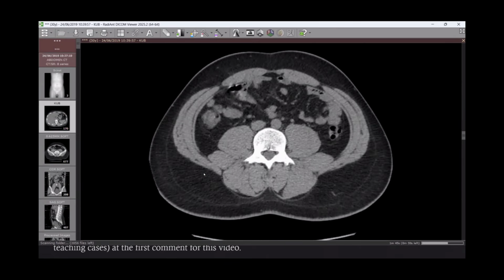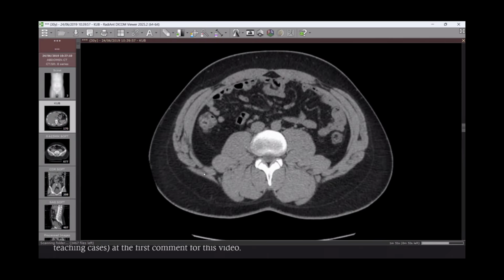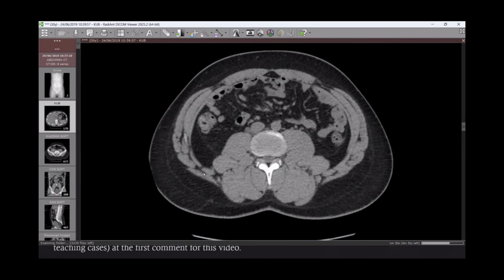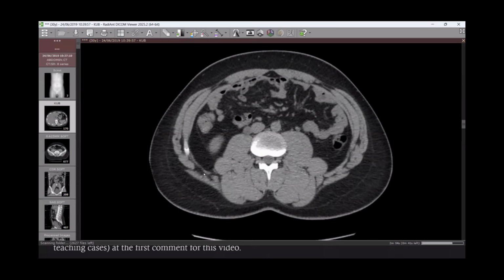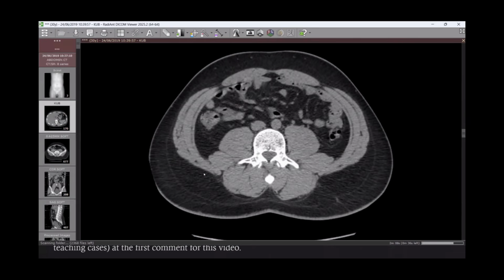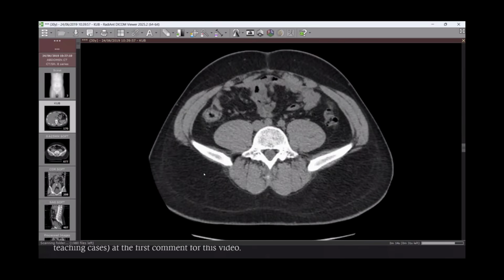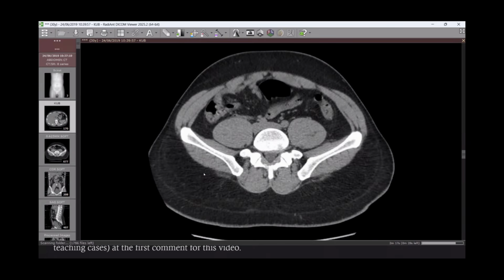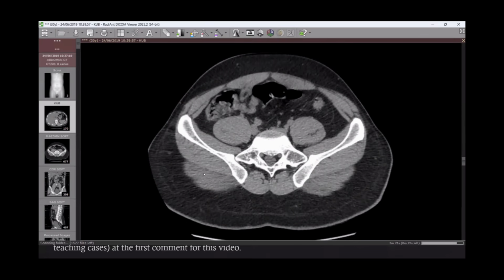I couldn't identify the right ureter at this level. However, I couldn't see any soft tissue mass lesion or dense stone in this area. While tracing, I can see curving of the right ureter posterior to the IVC. I'm thinking now of other possibilities like retrocaval ureter, while I'm still scrolling down through the images to see if there are any abnormalities in the pelvic region.